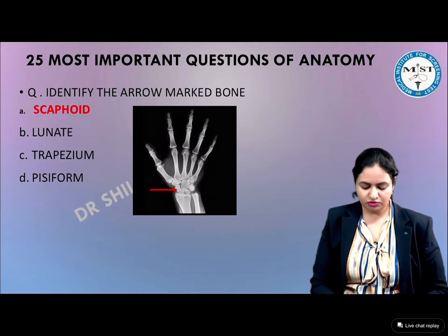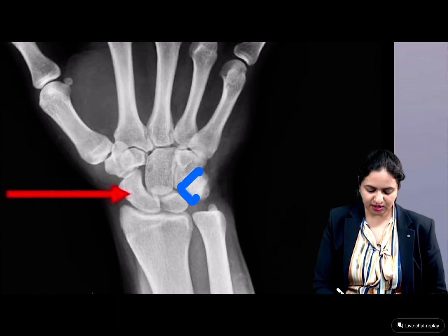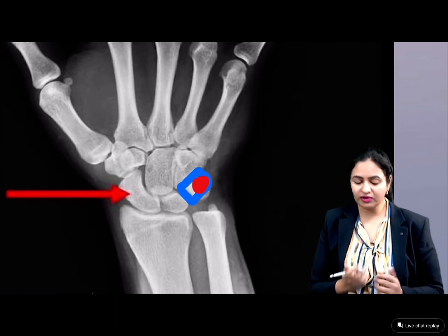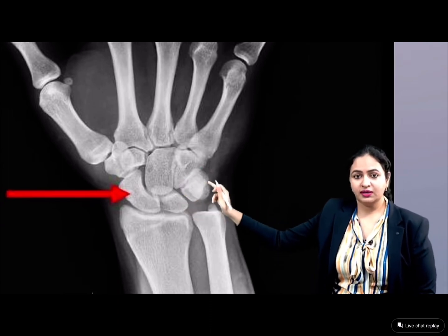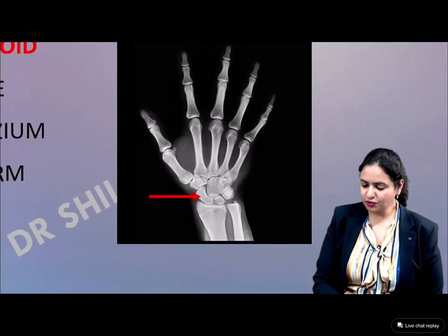When we are talking about the triquetral, if you see over here, this is the triquetral and the pisiform is present just over it, so they are basically overlapping. Again, if you see, you can see one shadow in this way and another shadow coming which is overlapping it. So these 2 bones are overlapping each other.